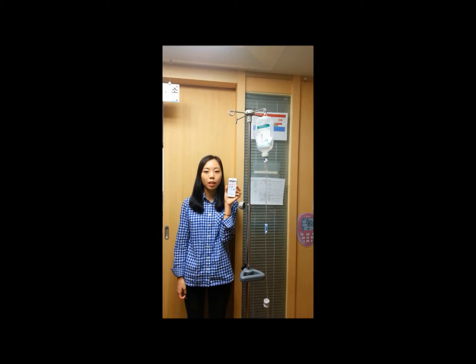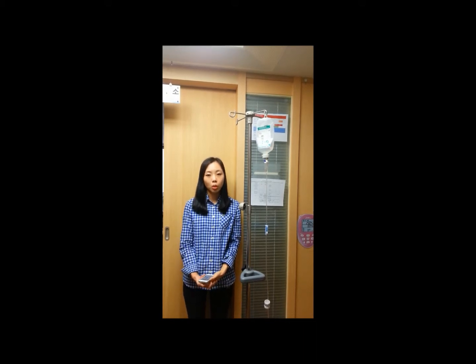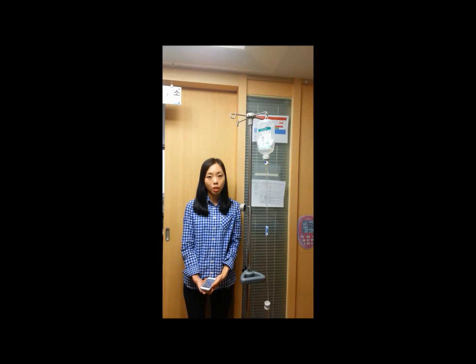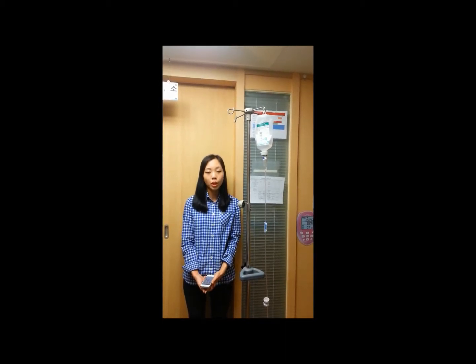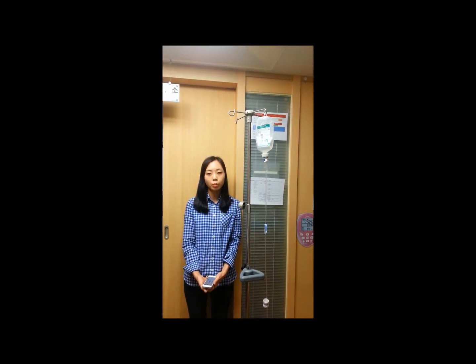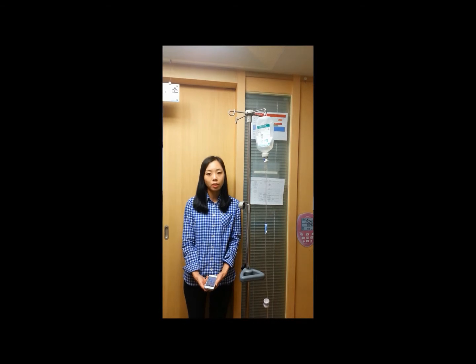Before I do this, let me give you a little background. Most inpatients receive some type of IV therapy. The flow rate is important, just as dosage is important when taking oral medication. According to SCI articles in 2011 and 2012, a wrong flow rate was the most frequent problem during IV therapy in hospitals, and it accounted for many serious errors.